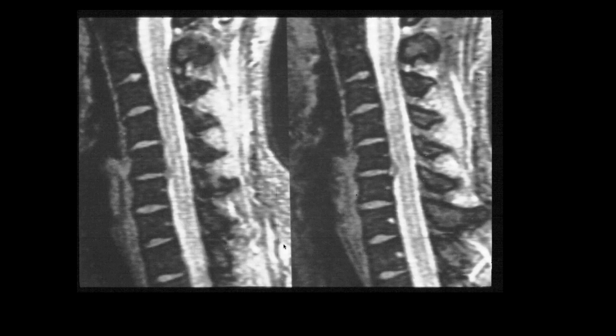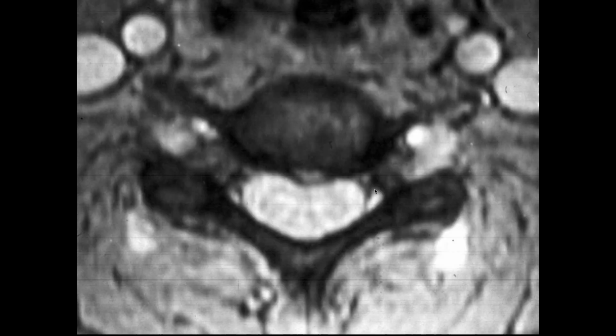So you've just recently seen these slides. I won't show them. In the old days, we used a lot of gradient echo type imaging in the cervical spine for reasons we don't need to go into now. We've got much better technology now, but here we can see a nice focal protrusion of a cervical disc. Here it is in the midline. And this is windowed, so you can't see the cord, but obviously here we have a cord, not nerve roots. So herniations can have a little bit different impact because you've got a large cord that you can compress and affect.